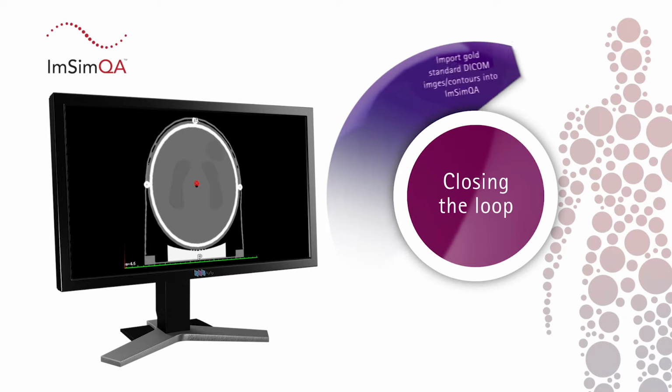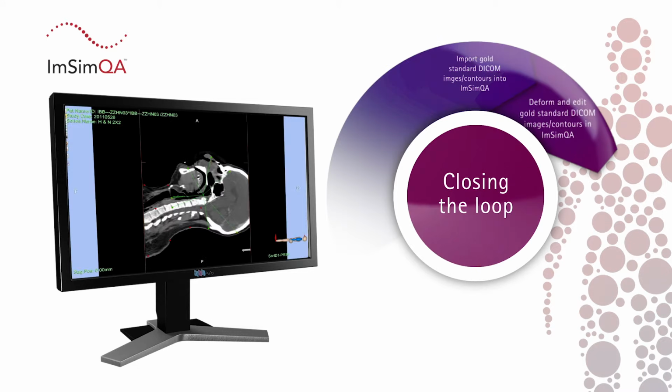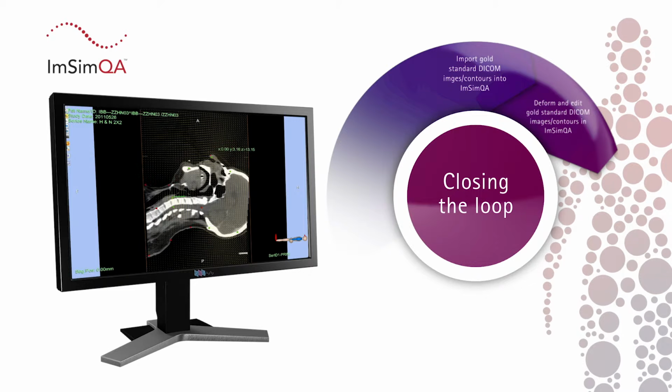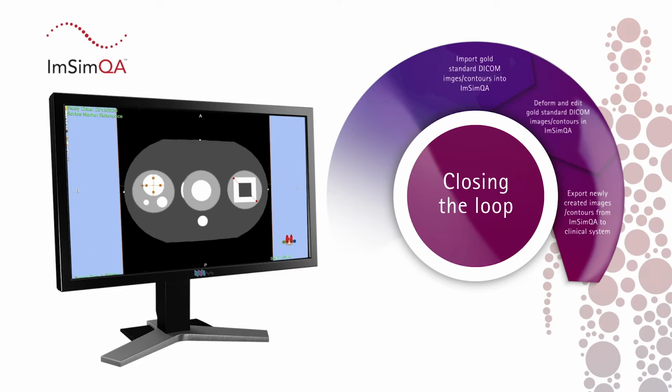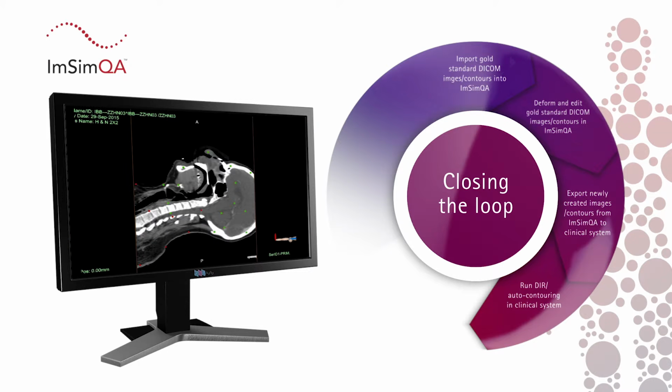Import center-specific DICOM images or use the ImSimQA library of any 25 virtual phantoms. Deform and edit the images within ImSimQA to create a gold standard dataset. Export the deformed images and structures to your clinical imaging system. Run DIR in the clinical system.